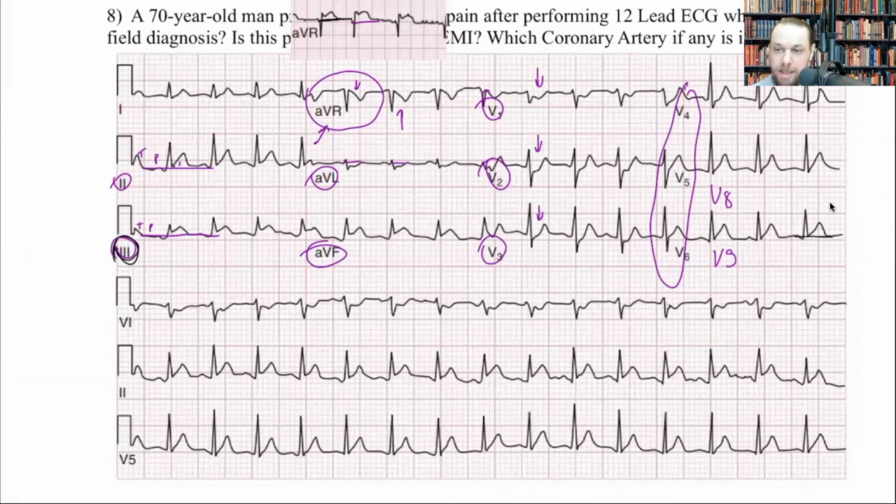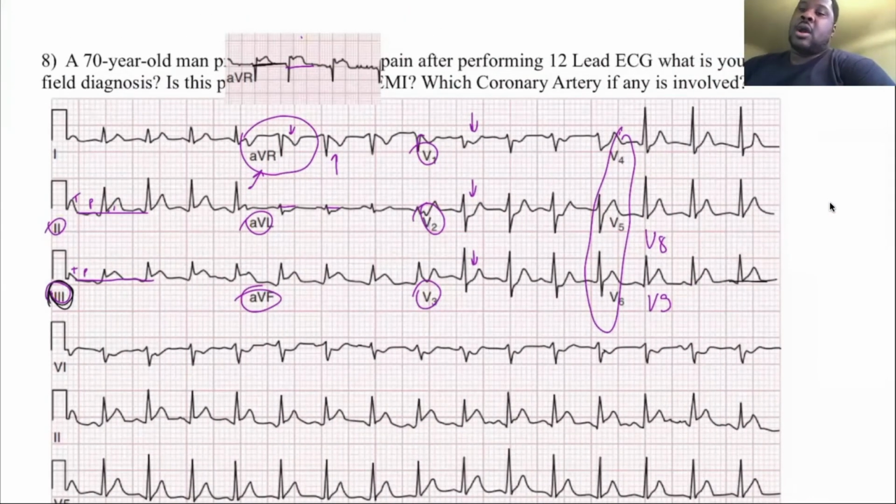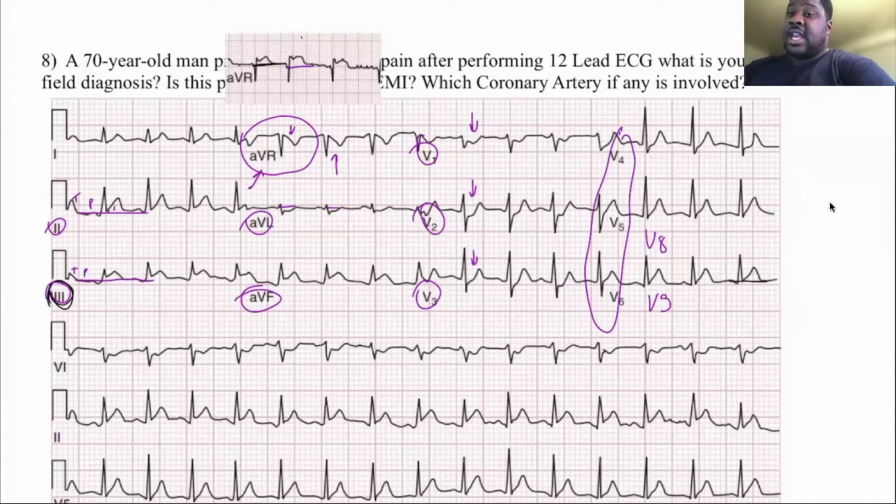It's basically like cementing your diagnosis, right? If you have depressions with elevations, it's clear cut. So V4, V5, V6 would show that there is blockage in the circumflex. Yes. So in any EKG, if you see depressions in 2, 3 and AVF, and you see elevations in V4, V5, V6, would that still state that there is an occlusion in the circumflex?